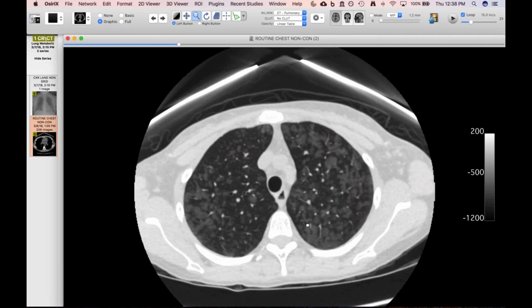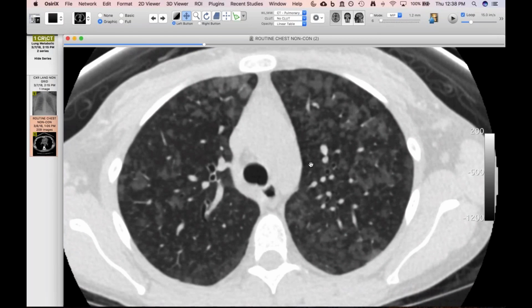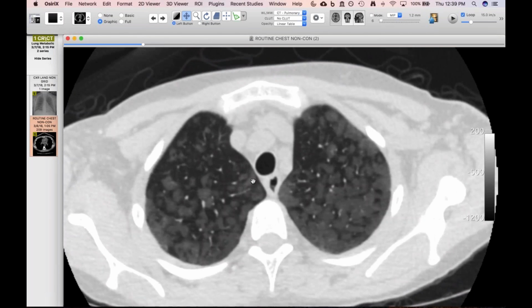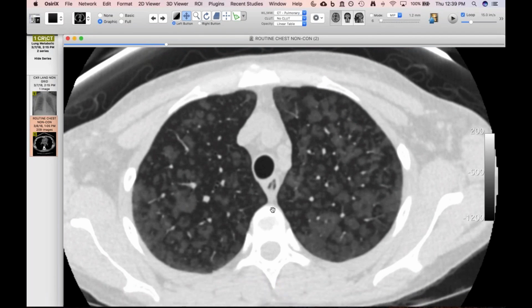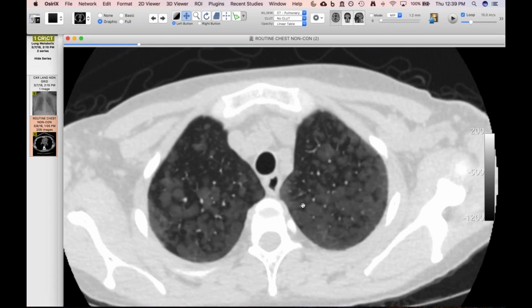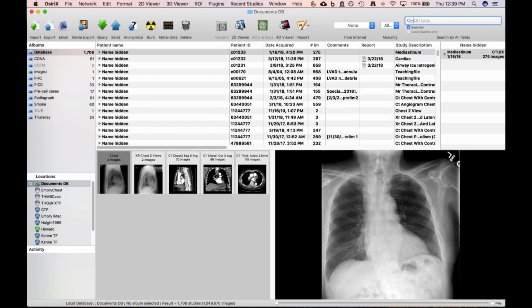So as a sequela of pulmonary hemorrhage and stuff like that, you think this is very, very fine calcification? But this actually looks like less than soft tissue density here. So it doesn't have the density of muscle. No, and yeah, I agree. And so I'm just wondering, I don't even know if the hemorrhage was true, like true hemorrhage. If that was just some sort of red herring or something.